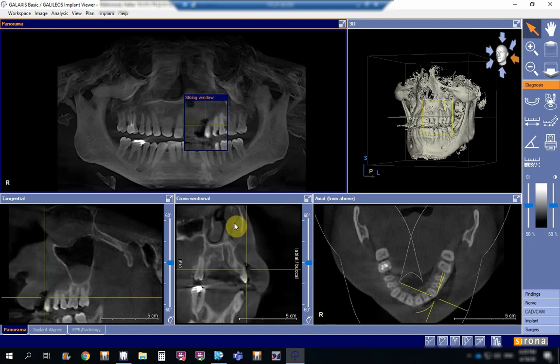The images that we see are magnified. Magnified means that what we see in the image of the object is in reality bigger than the object in the patient's body.